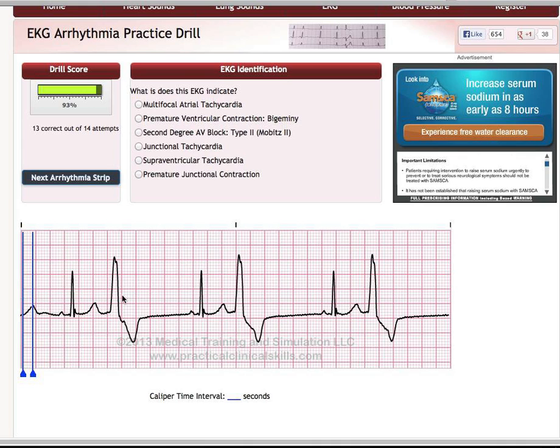Let's look at the P wave. We have a P wave for every QRS, yeah. Is this a QRS complex? No, this is not. I won't tell you what it's called yet. How about this? P wave, QRS, that's good. P wave, QRS, that's good. QRS complex looks to be nice and skinny. PR interval looks to be nice and short, so we know that's healthy. So mainly we need to figure out what the heck is going on here.